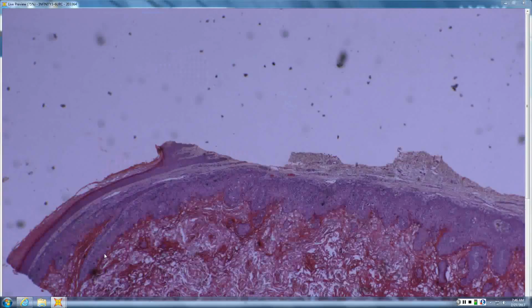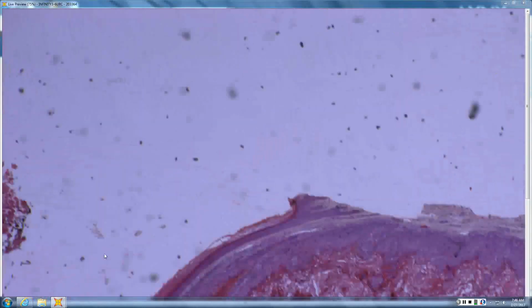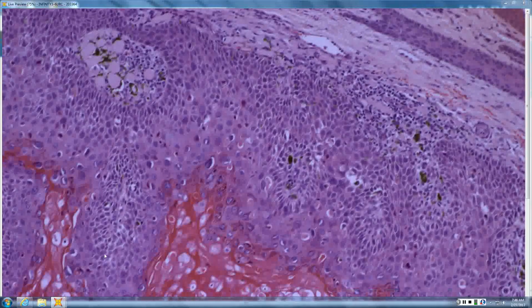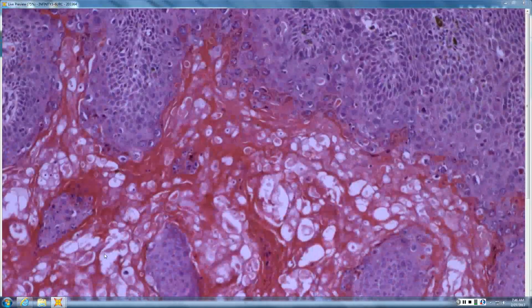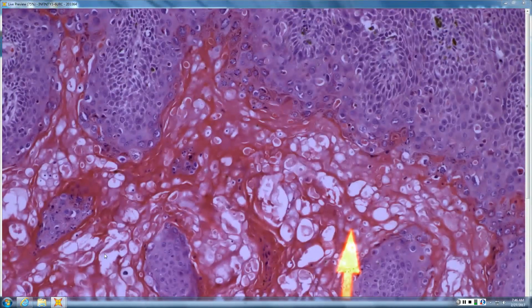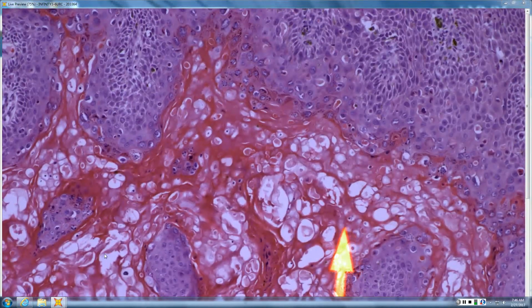So this cyst was removed from a patient. Tell me about the cyst lining. It looks like it has some almost blue granular cytoplasm within the cells. Tell me about the corneum within the cyst. Is it lamellar, or is it compact red, punched full of round holes? Coarse, punched out, full of holes. I would think a verrucous cyst, maybe.